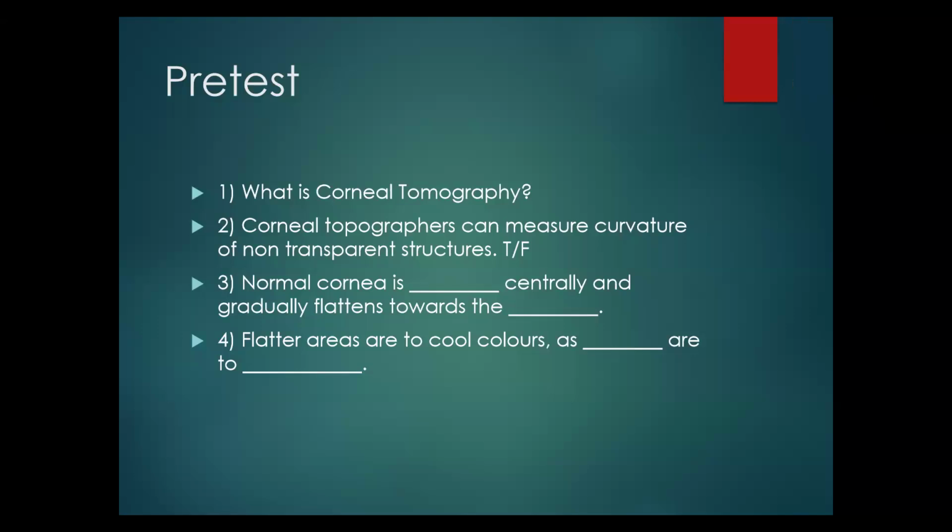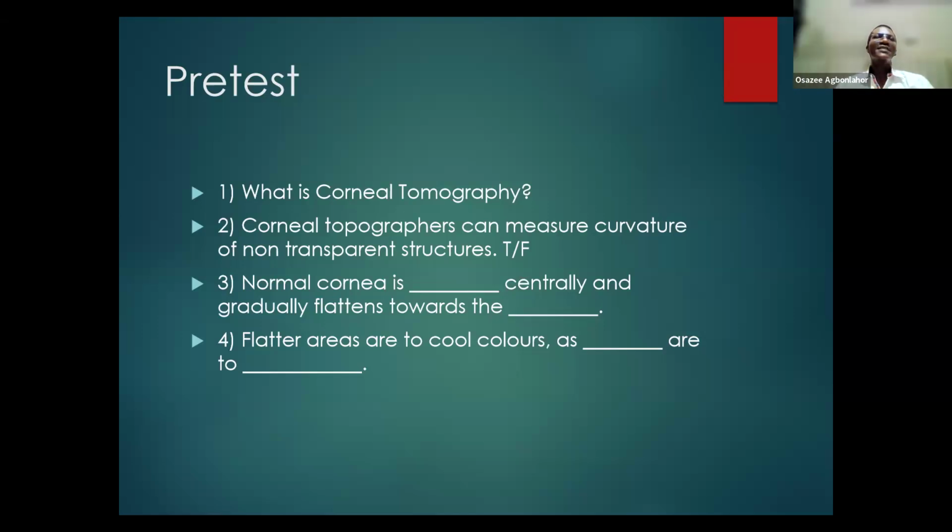Doctor says like a 3-dimensional view. Is it like a 3-dimensional view? No, three-dimensional view is different. When you talk about 3-dimensional view, you are looking at depth. It's different from what we are looking at now. Depth is not what we're looking at now. It just gives you information, just like you slice something from the superior or anterior surface down into the posterior surface.